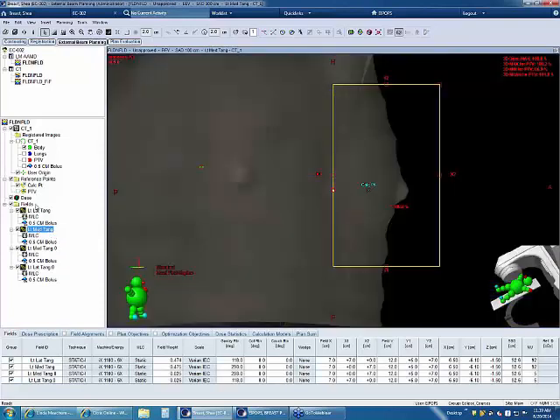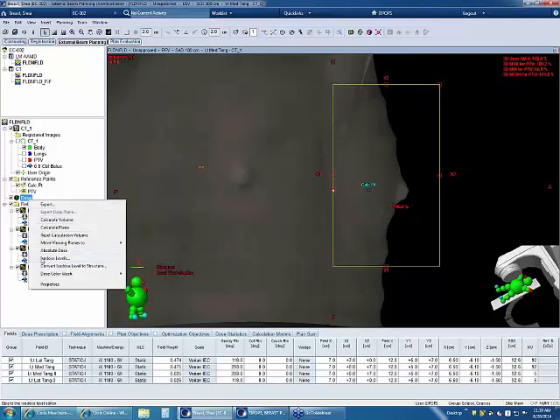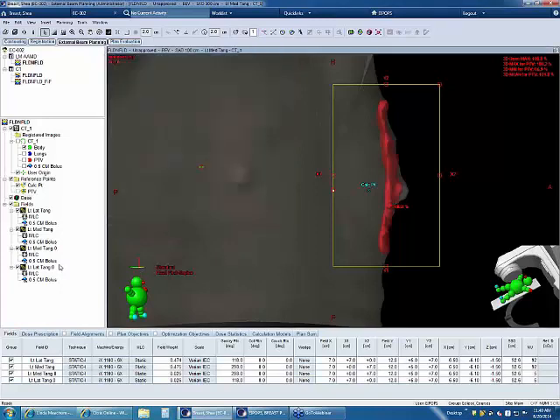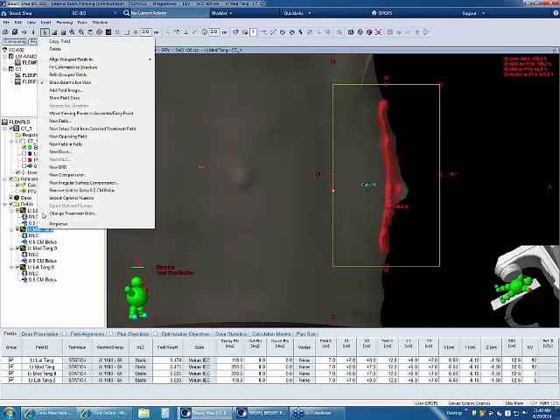And I'm going to choose another isodose line. I'll say isodose levels, and this time let's choose something like, you're not limited to whole numbers. I can say like 107.5, say apply. Let me see if 108 is any better, and hit apply. Nope, maybe 107 will be better, and say apply. Yeah, I'm going to say OK. And then I can come back over to my medial tangent, and whoops, right click, say new field in field.